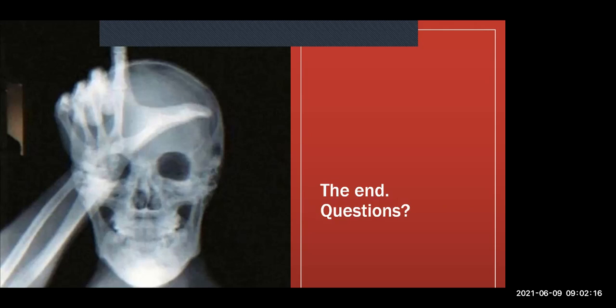Do you want to re-look at another x-ray? No, everybody happy? Everybody on Zoom happy? Okay. So next week, we're going to look at a few other examples, all right? What I'll do, I think I'll put the old lecture back on as well. I'll post it on the group, so those who haven't seen it can watch it again, and then it kind of marries the two things together. That's why I didn't spend too much time on a lot of the theory today. We were just looking at x-rays, okay?